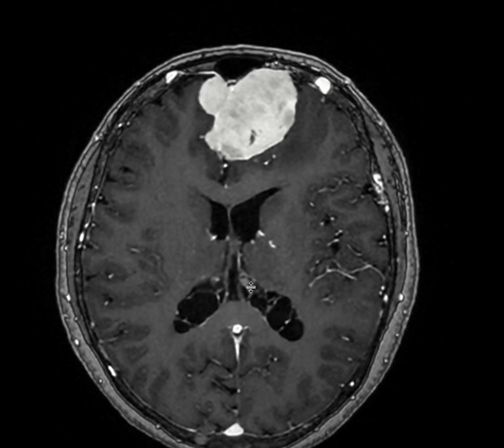So just remember, when we look at these brain lesions, we need to make this distinction. First of all, is it intra-axial or extra-axial? We use these different features that I just discussed to decide what type of tumor it is, and after that, we come to our differential diagnosis. Is it a benign meningioma, or other dural-based masses, or other entities? We have a lot of lesions that are dural-based and are not just meningioma. We can have sarcoid, we can have lymphoma, we can have dural-based metastasis. Just remember that step by step. Go through your search pattern and try to define whether it is an intra- or extra-axial mass.